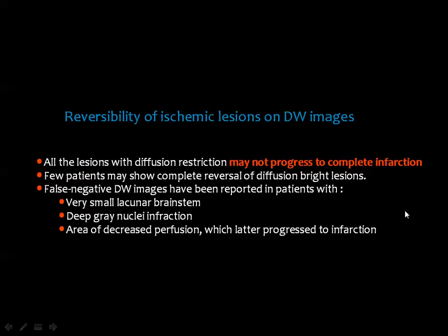Then sometimes you get reversibility of ischemic lesions, and this is well known in cases of posterior reversible encephalopathy, for example. And the lesions with diffusion restriction may not progress to complete infarction, and sometimes you get reversible changes, and the lesion will not continue to the full-blown picture of ischemia. Then few patients may show complete reversal of diffusion bright lesions. I will show you some of this.